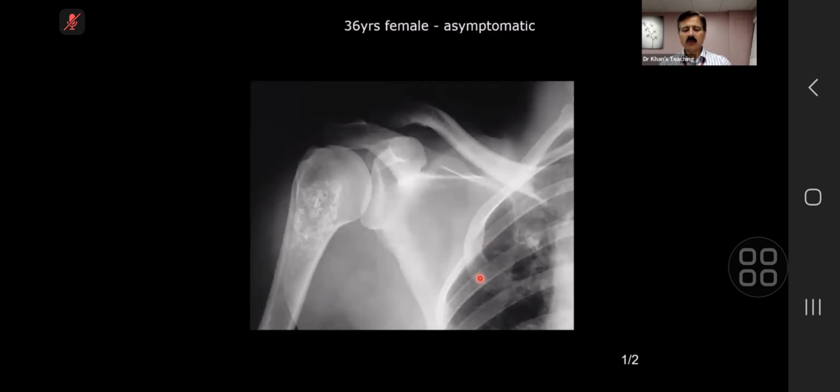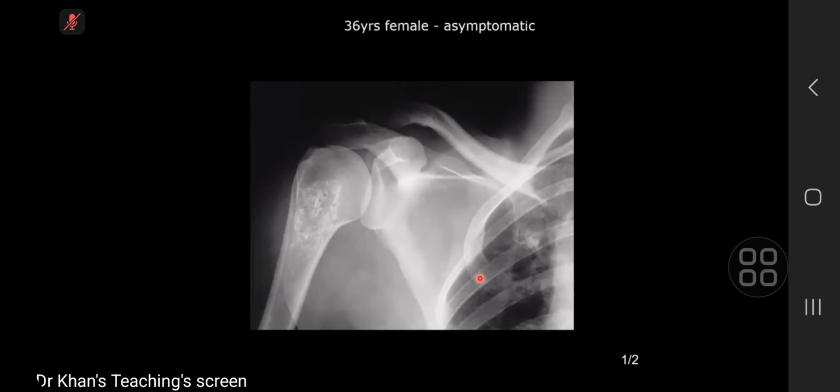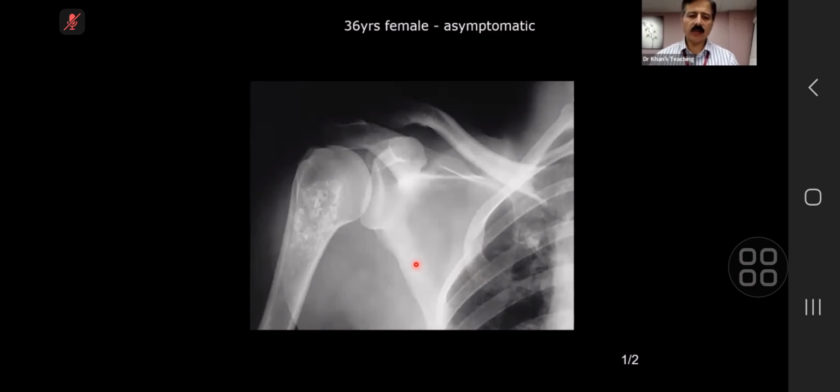Spot diagnosis. What is your diagnosis? It looks like an enchondroma of the right proximal humerus. Right. So enchondroma. Now, if you can make a note of what I am going to teach you right now, if you've got a pen and pencil, these are take-home points. They will show you enchondroma in the exam with signs of malignant transformation. Classical viva questions will be where the examiner is going to lead you: is there malignant transformation or not.